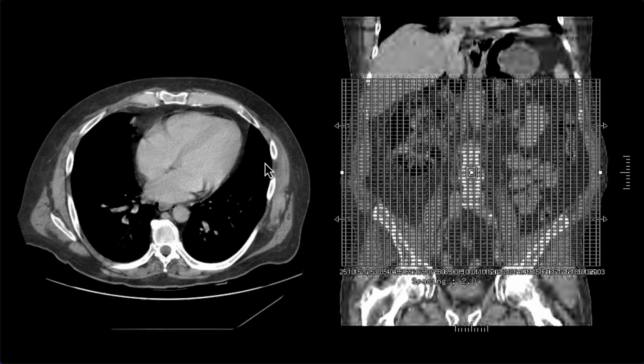And of course, be aware of abscess formation, which can start as microabscesses and form larger collections, which can even burst outside the kidney. And then be aware of stone formation that can be complicated by infection and require urgent intervention. All right.